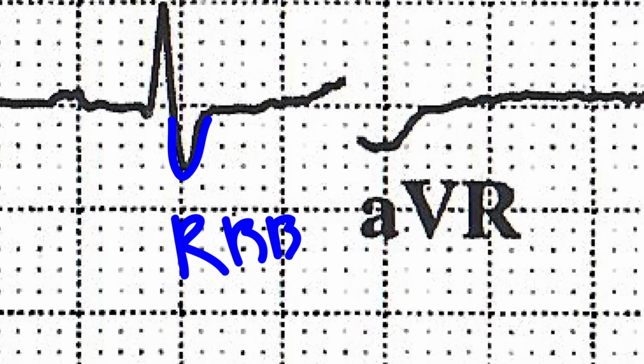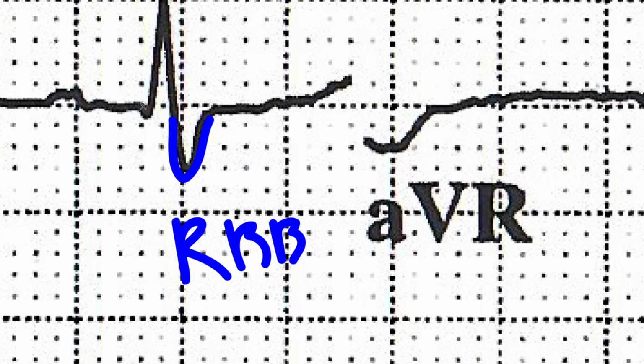Okay, so I want to take a look at the width of this QRS, and it really starts right here on this line. We move over one box, that's 40 milliseconds, 80 milliseconds, and it would end right about there. So this QRS is 120 milliseconds wide or long.